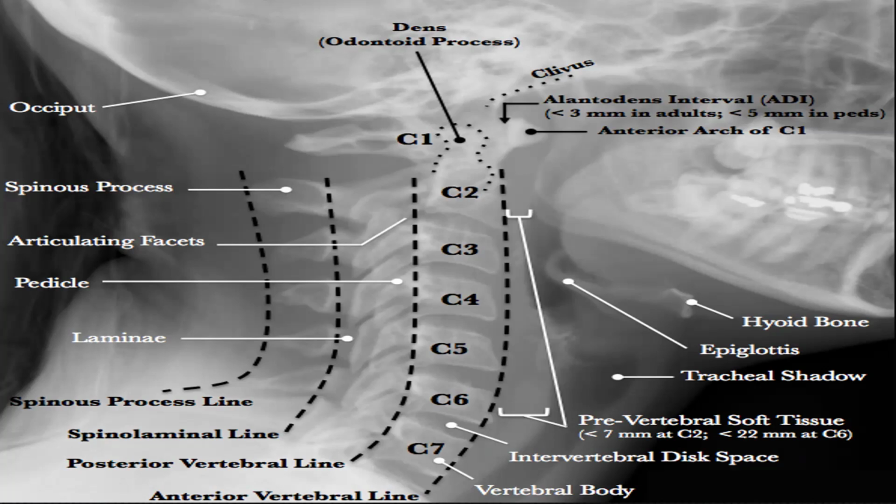This completes our A. Are you with me till now? So in A, we read what is normal and what is abnormal. Normally, the alignment is normal, that each line is on its provided space. How do I know the alignment is normal?